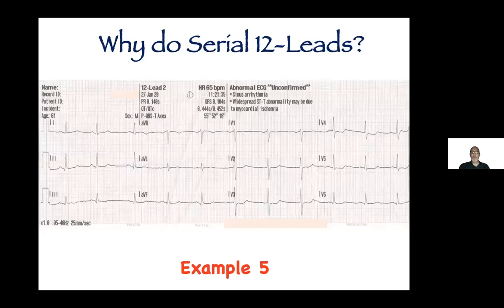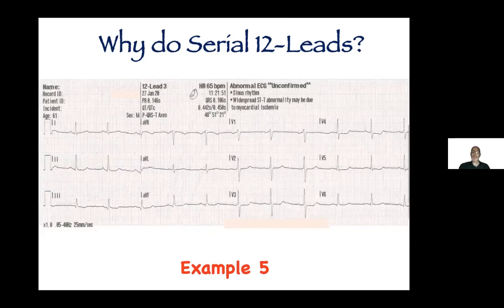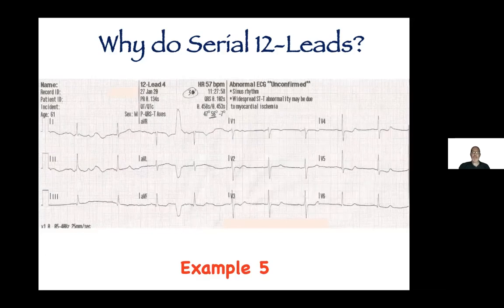Here's another one. This is the patient. Unfortunately, this was not a good outcome. This man ended up dying in the cath lab from just profound cardiogenic shock. The first EKG is showing some non-specific changes. I'm just going to go through this, and you can actually see how this has evolved. This is not a PVC, by the way. This is just some artifact. So you can see how this is evolving.